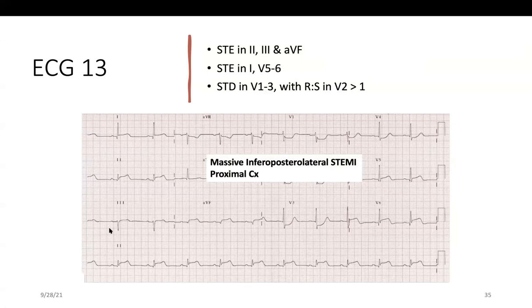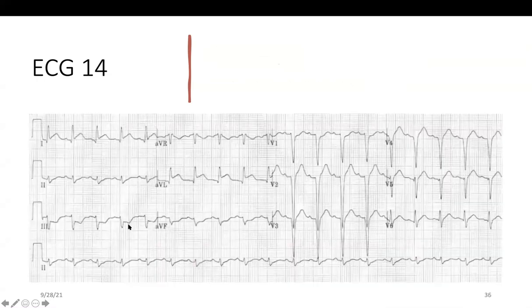Okay, so this, again, because 2 and 3 are almost the same, or 2 more than 3, it's CIRC more than RCA. Okay, what about this ECG?